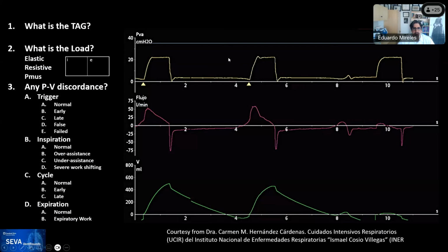Acknowledging that you may not be able to set the targeting scheme just by looking at this, you should be able to set some level of knowledge on what we are controlling. So what do you think the breath control variable is here? There are only two options, volume or pressure. So enter your thoughts on the comment section of the board.